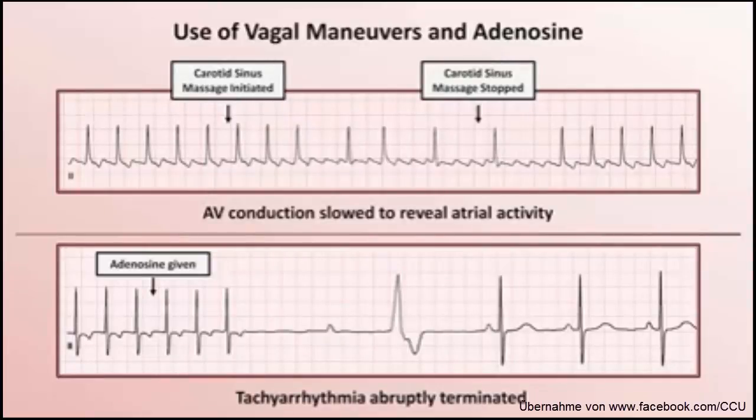There are a couple of other interesting features of the strip. First, notice that there is a delay before the sinus P waves restart after the arrhythmia is terminated. This transient delay is due to something called overdrive suppression, which will be discussed in a video in the Advanced EKG series. And then once the sinus node restarts and we see P waves, we still don't have any AV conduction since the AV node is blocked for about 5 seconds. Thus, the unusual wide QRS complex in the middle of the strip is something called an escape beat due to normal automaticity present in a latent pacemaker within the ventricles. The bump in that beat's deeply inverted T wave is a dissociated P wave.